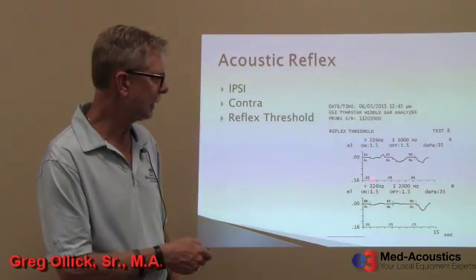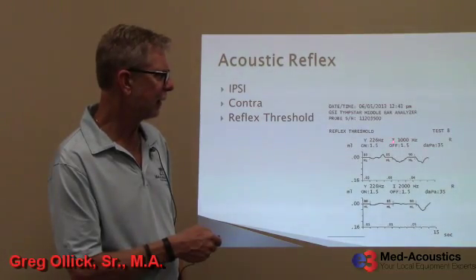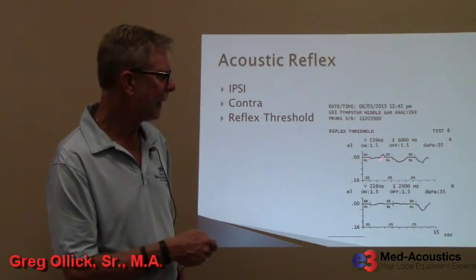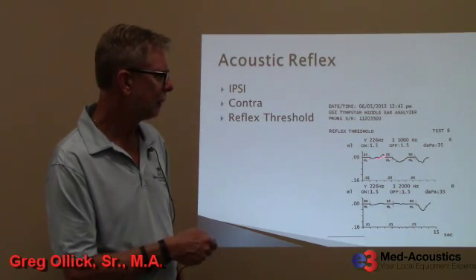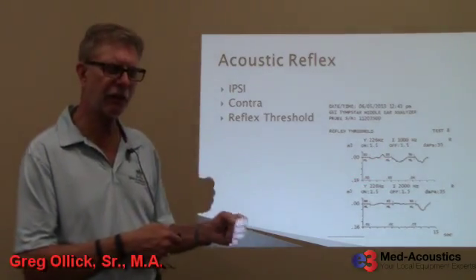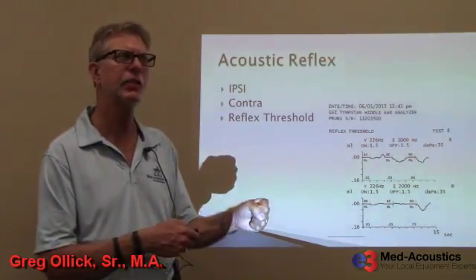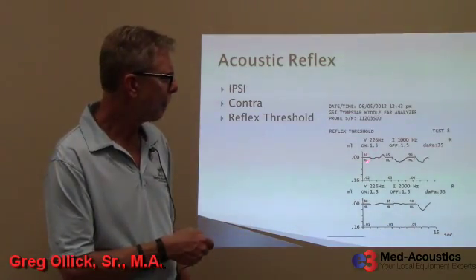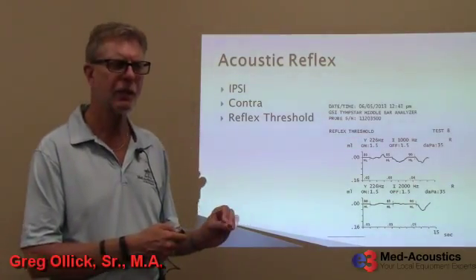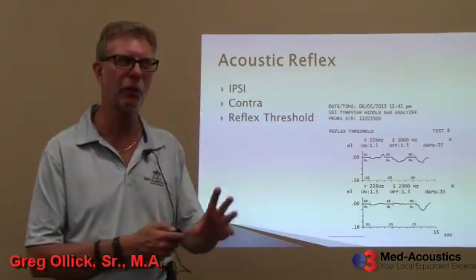It would be something like this. Here we were doing an ipsilateral. That I there indicates ipsilateral stimulus at 1,000 hertz, and we applied it at 80 dB, and there was insufficient movement to call that a threshold. A change of compliance occurs due to the contraction of the stapedial reflex muscle, pulling back the ossicular chain and therefore making the eardrum a little bit stiffer. I don't use 0.02. Some people do, and a lot of the literature does, but that is just on the cusp. I like to say over 0.02, like 0.03 and more.